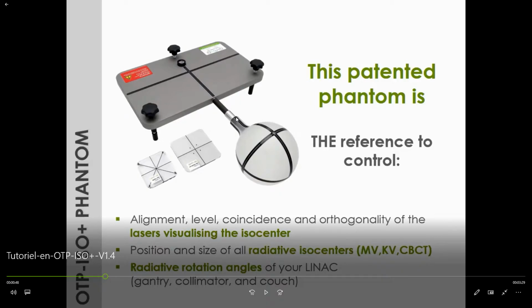The sphere is supported by a stainless steel plate which acts as a counterweight. A carbon rod connects the sphere to the plate. It has a metal ring which can be detected on the images, which will be used for measurements, given that when the test object is placed on the couch and it rotates, the ring will move as well.